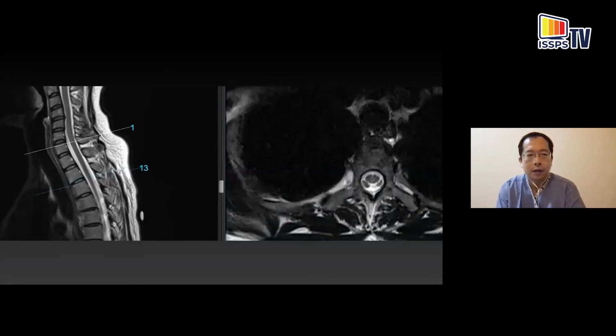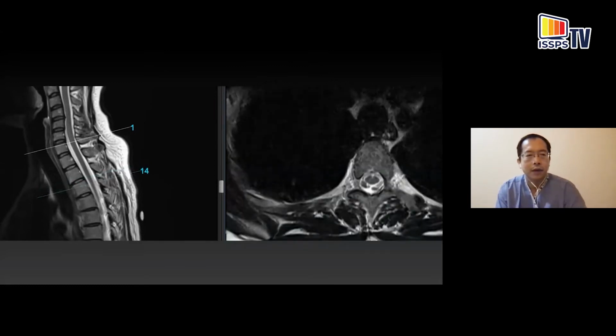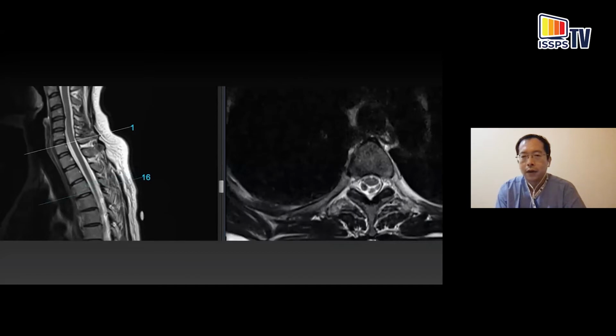Coming down, this is still upper thoracic spine. We're looking at T3 now, a similar anatomy as T2. Coming down to the facet joint level, the moment you see facet joints, you'll be at the top of the rib already. And once you're at the top of the rib, the other important landmark then, if you're angling along the disc, parallel to the disc, you're starting to get into the intervertebral disc space.